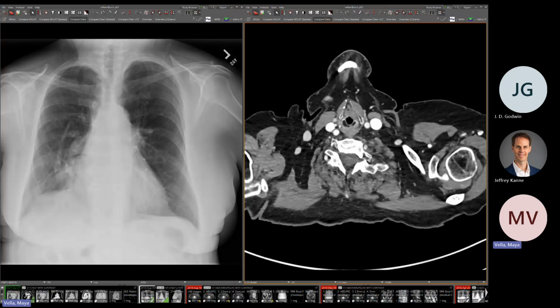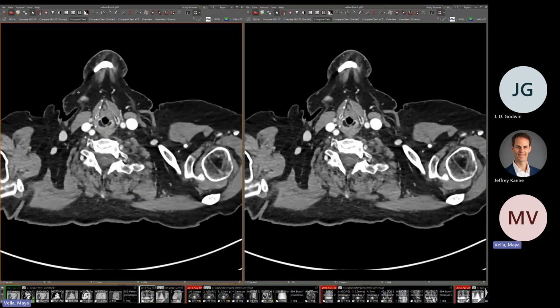Great. So this was just a cute, classic imaging finding that I came across today in this patient, because this patient just came in for a repeat chest CT. But on the radiograph, I think we see a very classic Aunt Minnie appearance, which is this linear structure here in the right lung, which, at least on this radiograph, looks like it's coming from the mid portion below the fissure and then coming down towards the hemidiaphragm. And this is just a patient with a classic scimitar vein.